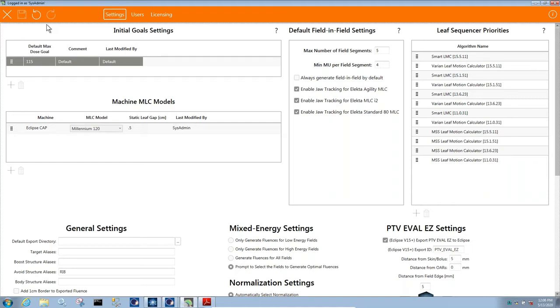If it can't get that 100% coverage with a max dose of 102, then it goes up to 103, checks to see if it gets coverage, and so on and so forth. And when it finally gets to the coverage goal, that's the hotspot you're going to get. So you're most likely going to see plans between 105 and 107, but sometimes you'll get a little hotter.